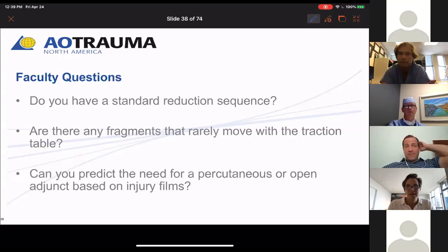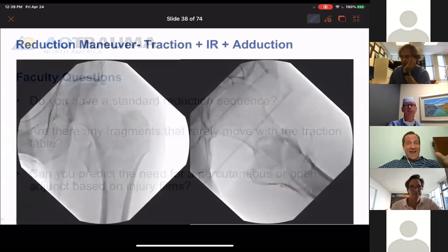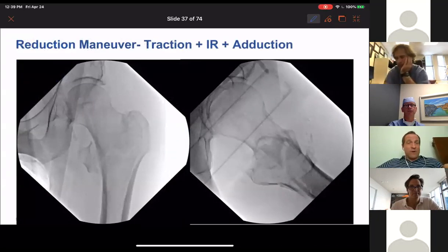Yeah, same. I agree. And then, it's interesting, and you alluded to it a bit, so this lateral hip view, which is essentially a lateral neck view, if you go back to one of your fluoros, honestly, it looks pretty good to me, and I would probably be close to happy.